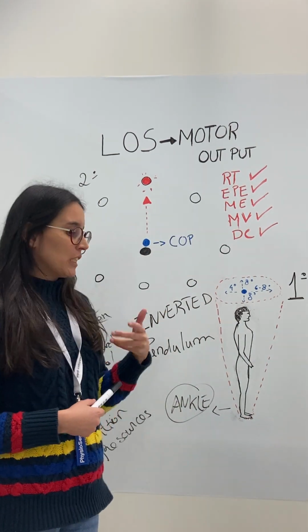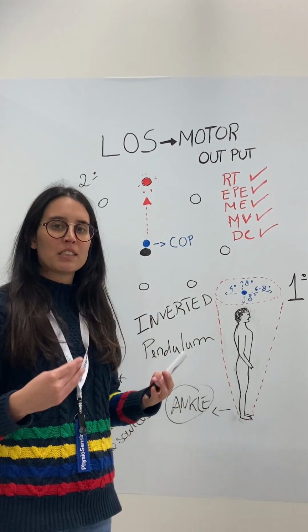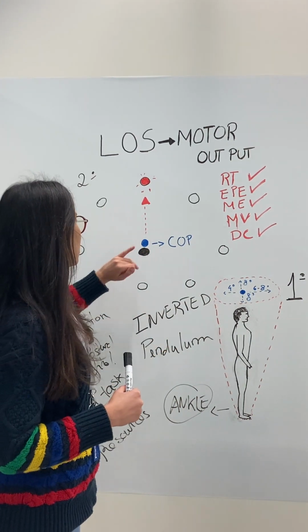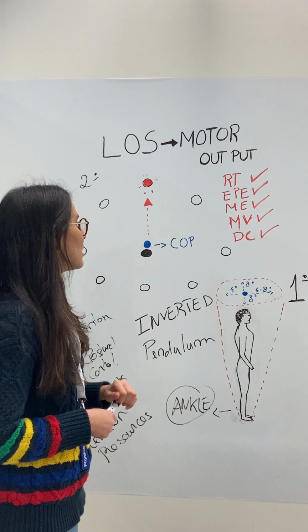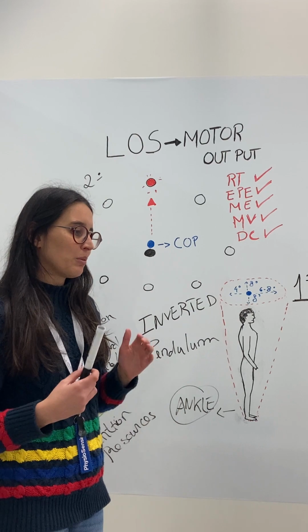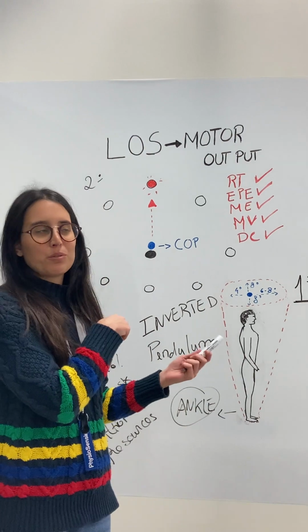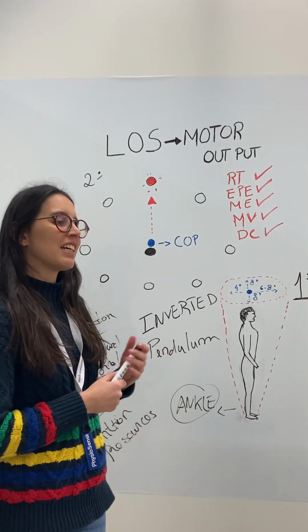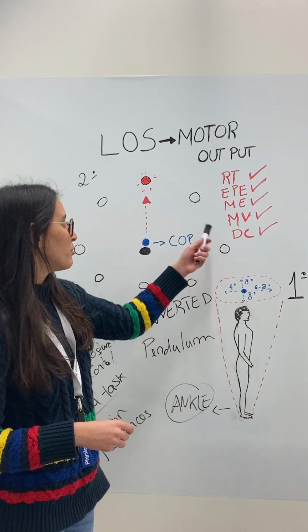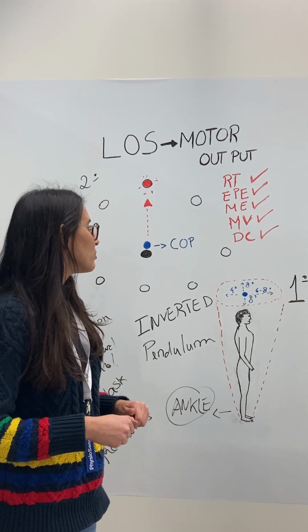The endpoint excursion is the first movement, the first try, and the maximum excursion is the maximum distance that we reached at the end of the 8 seconds that we have towards each one of the targets. Then we have movement velocity. This is a parameter that has to be interpreted in opposite of what we do in the static posturography. Here we want a high velocity, so the movement velocity is also a very easy parameter to understand.